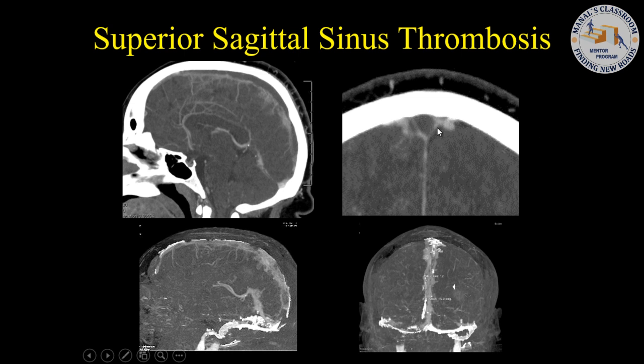And you can also see this appearance here. Now, the appropriate term for this is the empty delta sign. It's not the delta sign, it's empty delta sign. Why do I know that? Because I trained with the person that named the term empty delta sign, right?